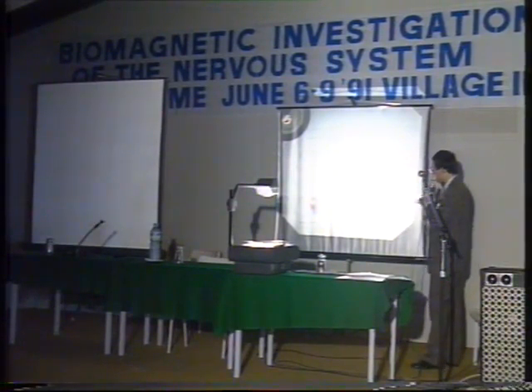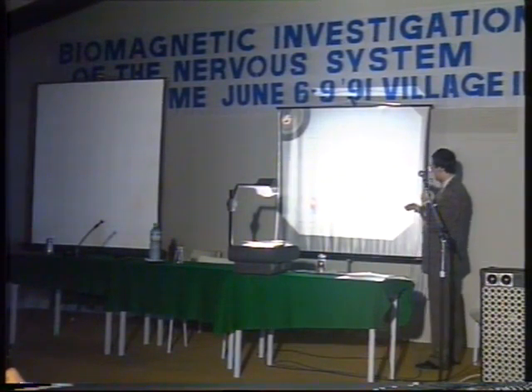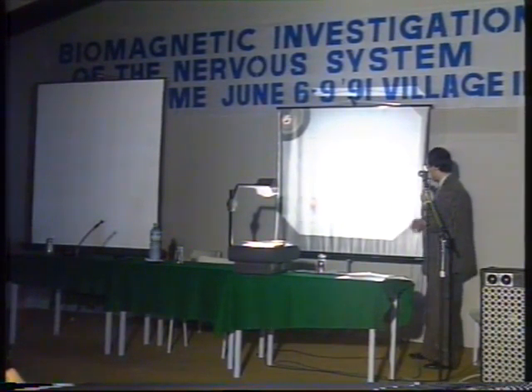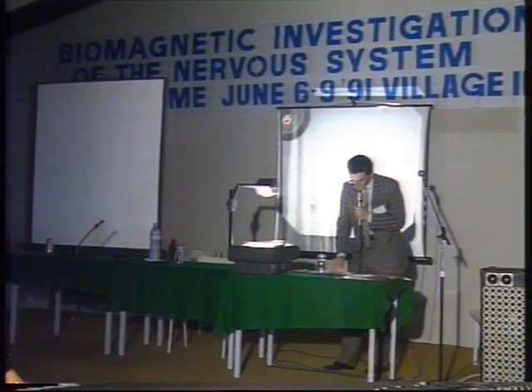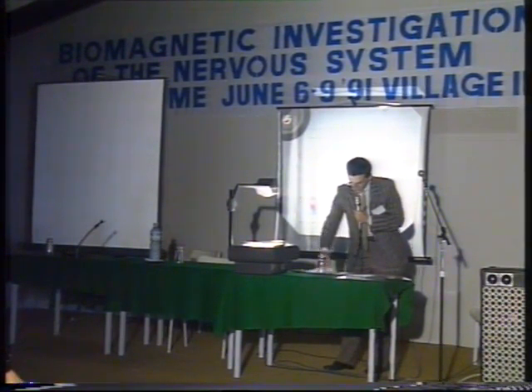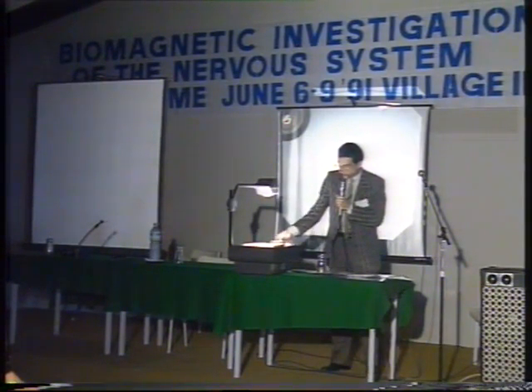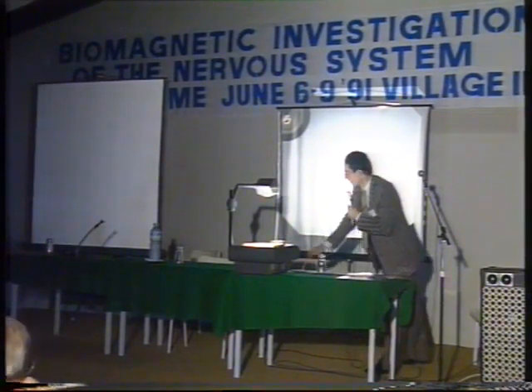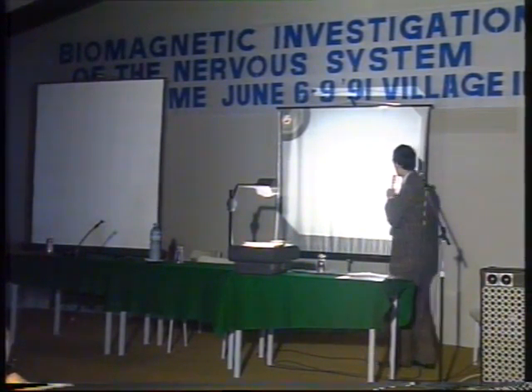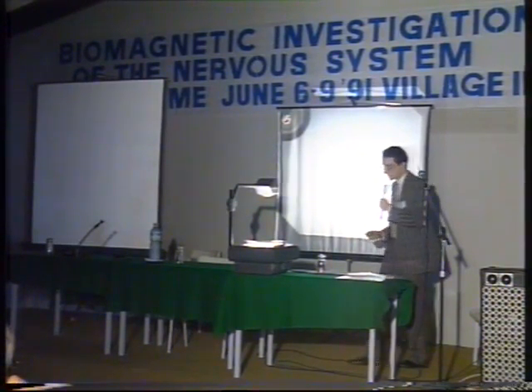This is again the good side, and you can see here the latency is 22 milliseconds, and the dipole is about where it should be, and the localization of this activity is also within our normal limits. I can show you this here. 3.2 centimeters deep, and you can see this from the other pictures. It's about where it should be.